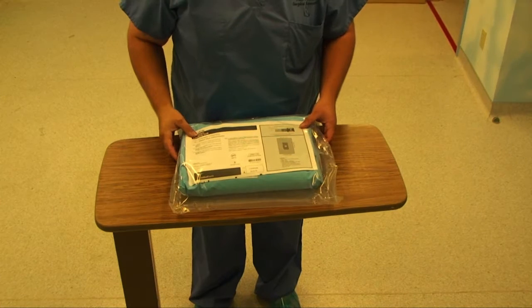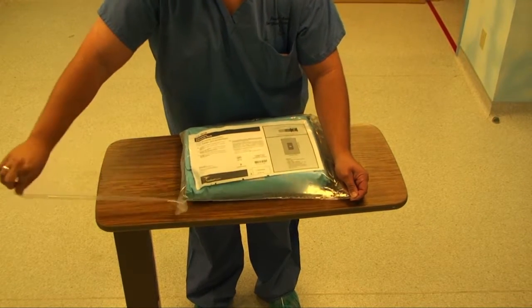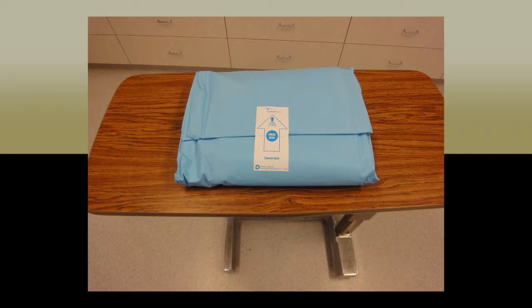To do so, tear the plastic along the dotted strip and place the folded pack in the middle of the back stand. The top fold, labeled 1, will be held to the rest by the white sticker with the dotted line and a center tab stating press here. You will position the pack so that the arrow pointing to the sticker that states open to back of table is facing the back of the table.